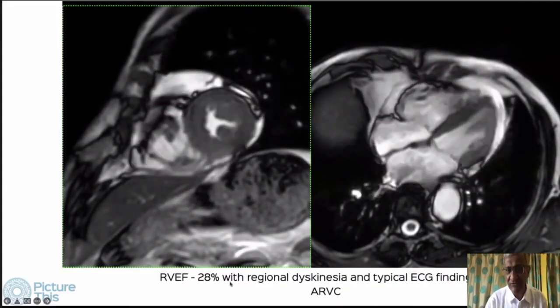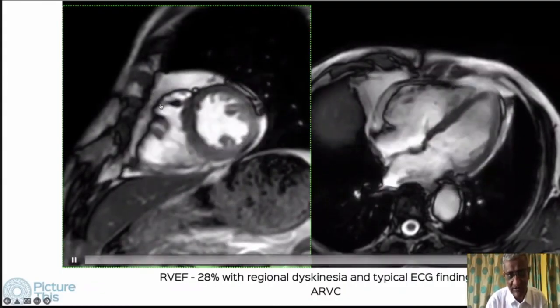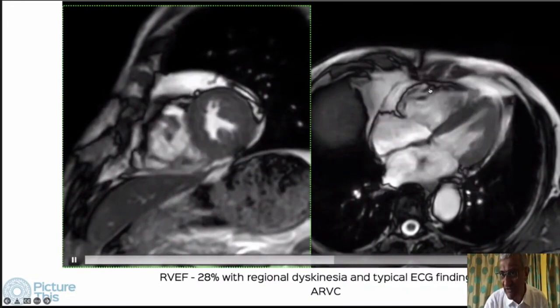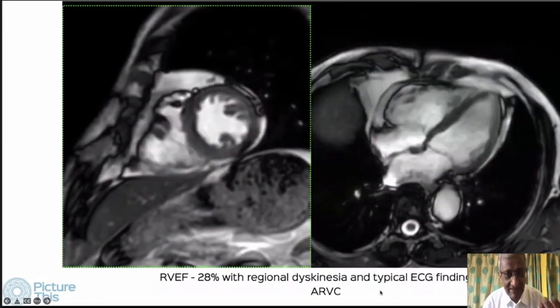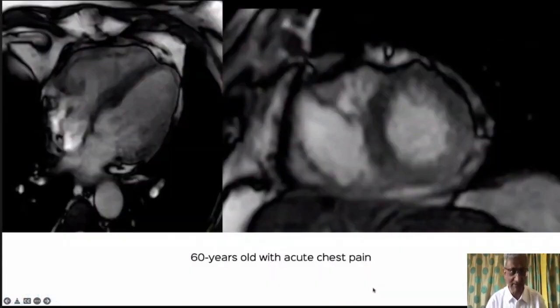This was the fourth question. The RVEF was 28%. You can see the regional dyskinesia, the accordion-like irregularity of the anterior wall, a little bit of pseudosacculation on systole. LV is normal. Patient had typical ECG findings as well, and this is ARVC.